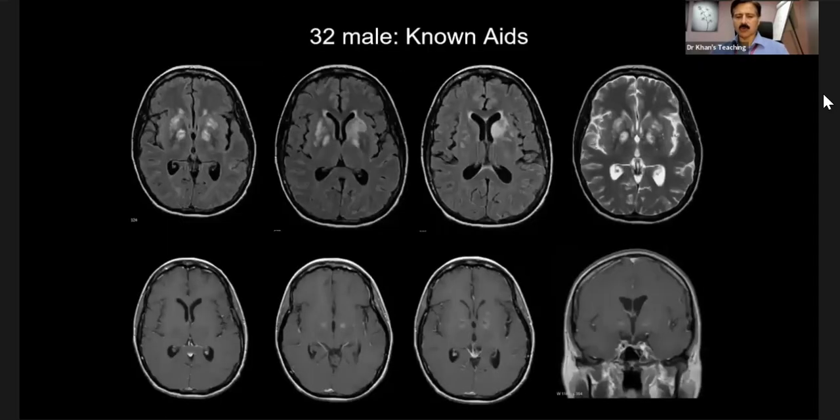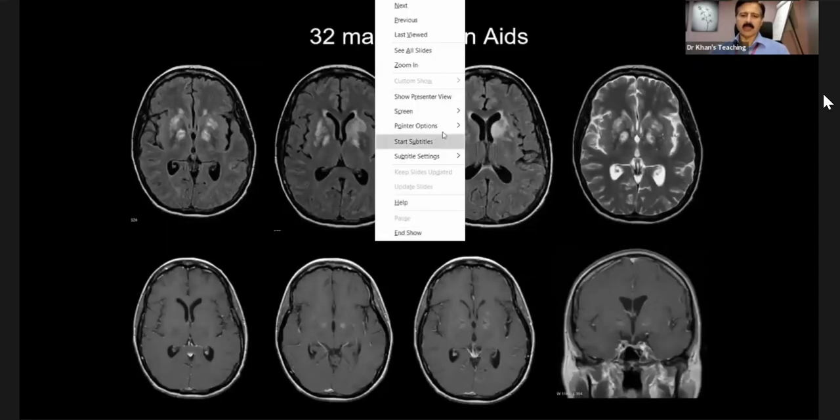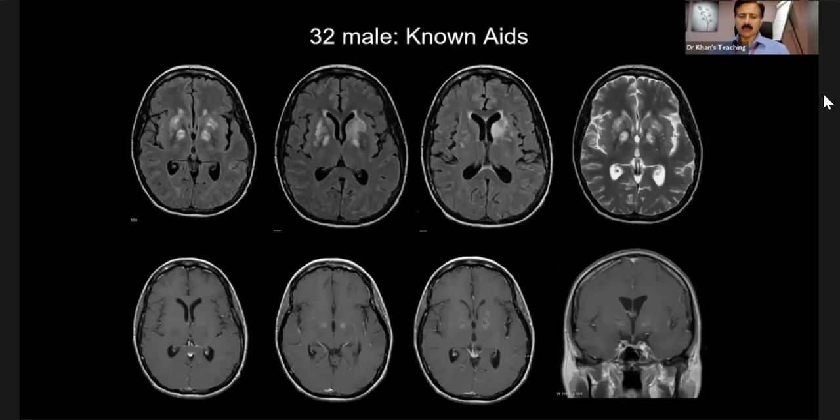What happens is that cryptococcus produces mucoid material, and it goes through the lenticulostriate arteries into the perivascular spaces. This is what we learned, perivascular spaces into the basal ganglia region, and it will give you a cystic type of appearance on T2 weighted sequences, for example, bilateral symmetrical. So it has gone into the lenticulostriate perivascular region, because it has produced mucoid material which is high signal.